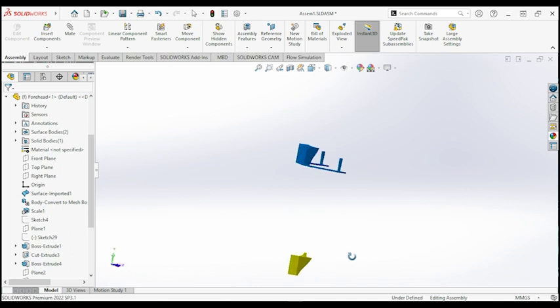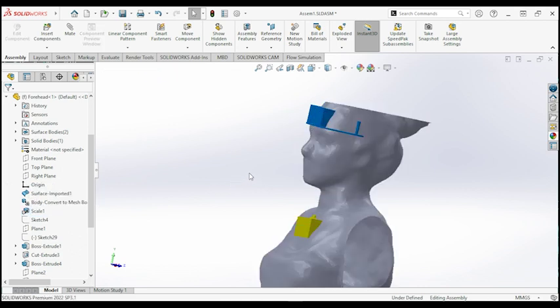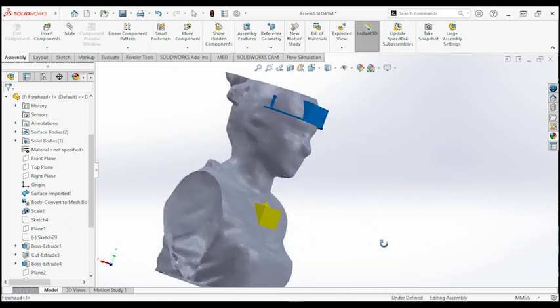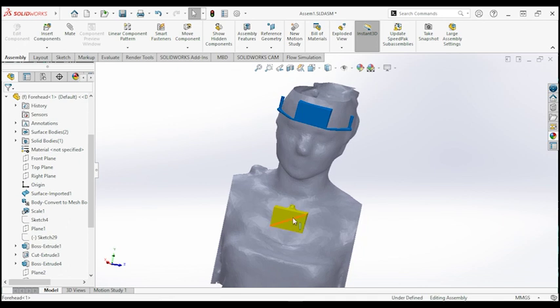To secure the markers and make sure they won't slide on the skin, the forehead marker is secured using an elastic band and the chest marker is hung on the neck using a rope. Both fixtures have checkerboard markers glued on, which will get detected later on in the video analysis section.